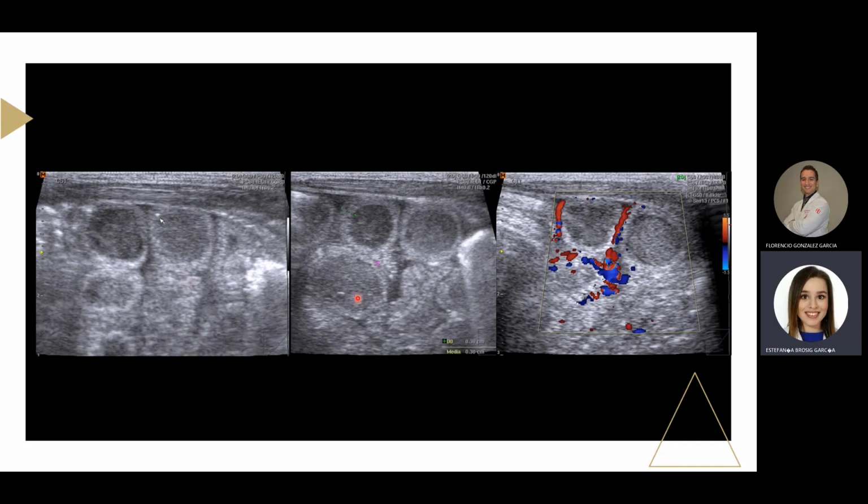We have 2 grayscale images and 1 color Doppler ultrasound image in the topography of the upper and the lower left quadrants, in which the intestinal walls are observed with loss of their differentiation, characterized by an increase of their echogenicity associated with echogenic nodal images that project a dirty shadow. These findings are compatible with pneumatosis.